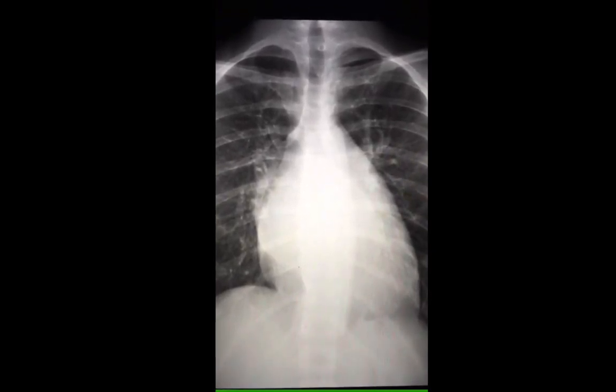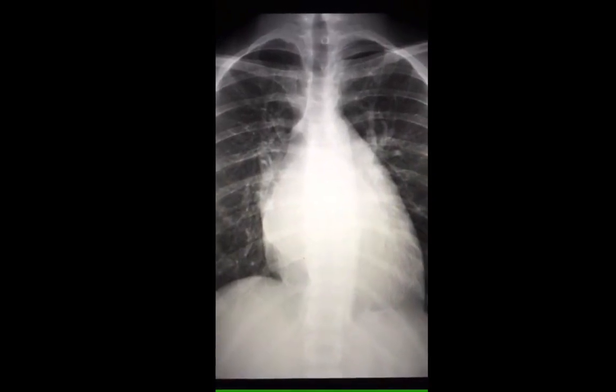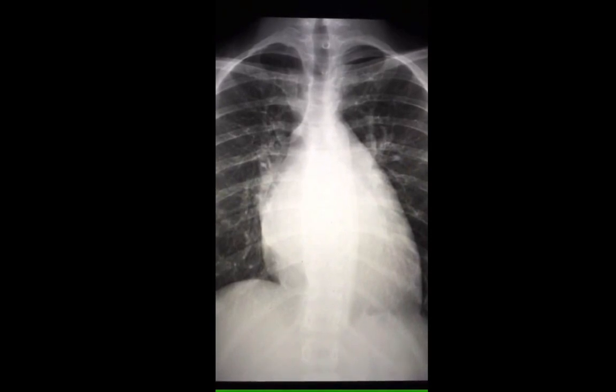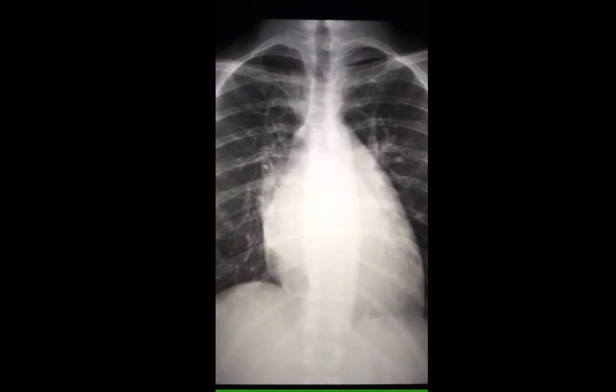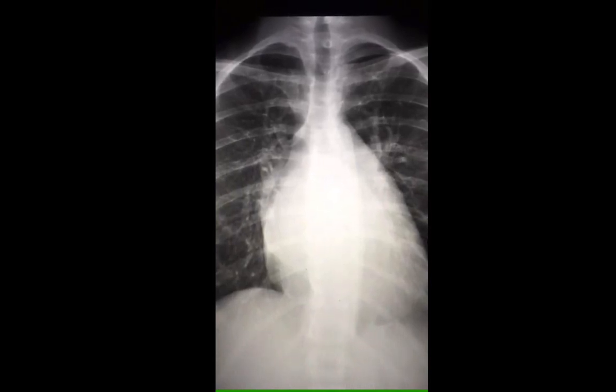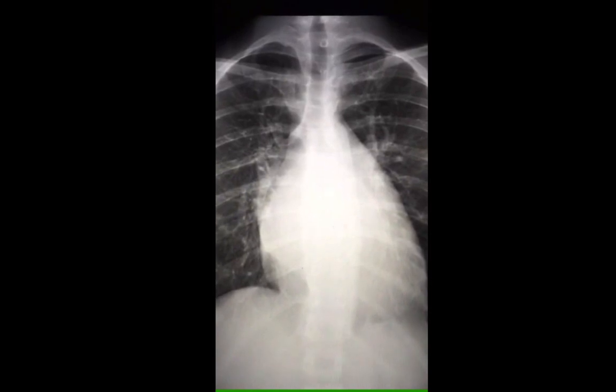return the blood normally. The final diagnosis in this case is mitral valve disease, namely stenosis, due to rheumatic fever in a young patient. So there's secondary left atrial dilatation and pulmonary venous congestion due to the presence of mitral stenosis.